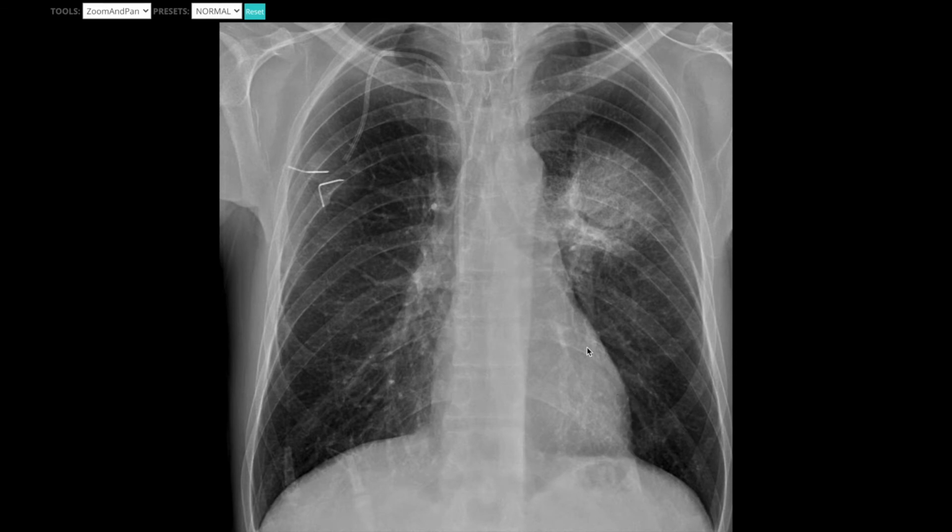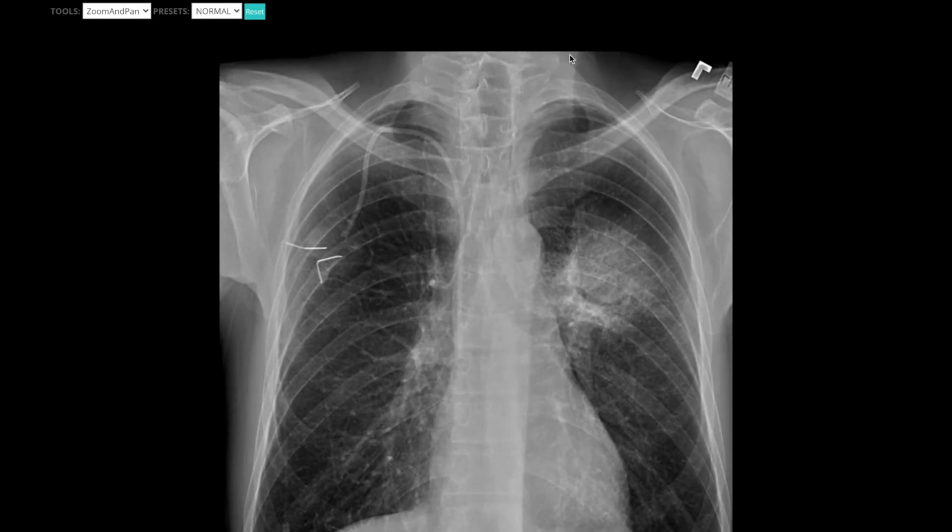So I always like to trace the border of the heart as well as the mediastinum, making sure there's no air tracking along it. Oftentimes it's very subtle. Usually it's a thin line, almost like little bubbles, maybe a patch of bubbles here, a patch of bubbles there, or going all the way across the heart border, and then also tracking up into the mediastinum and into the neck.